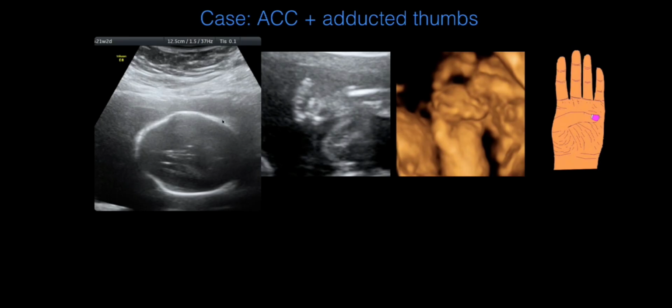So this was the lady. I'm sorry for the images. She was 180 kilo, 180 weight. She didn't fit in an MR machine, but we could see this. She had a previous child from another husband, 10 years old. She divorced and married a new one, and then she had this fetus. And she said, why do I have twice the same disease in 2 different children? And we assumed you are a carrier.